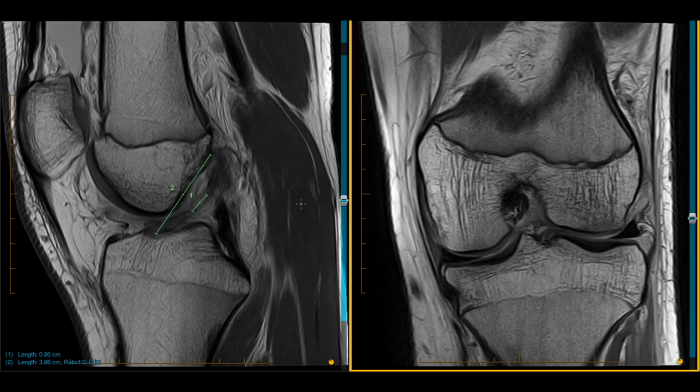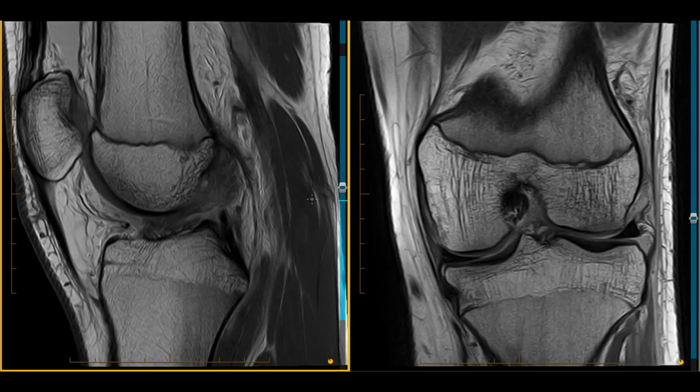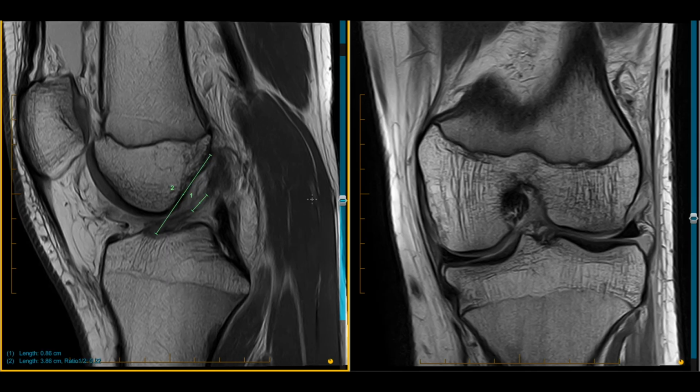This is a video to demonstrate how we actually measure the gap distances on the acute ACL injuries, and also how we're determining the ratio of the gap distance to the length of the ACL. So here is a fairly tall 15-year-old adolescent who's 185 centimeters tall. And we can see a ruptured ACL in the mid-segment of the ACL with a significant detensioning of this ACL.